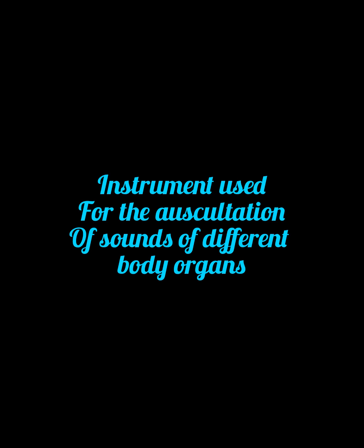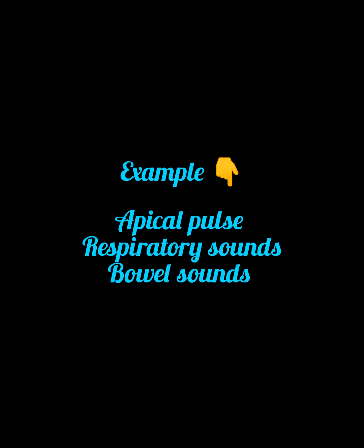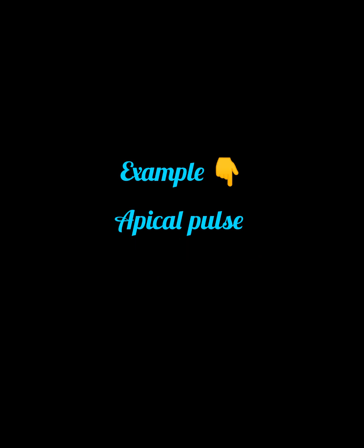So stethoscope is the instrument which is used for the auscultation of different sounds of the body. For example, apical pulse, respiratory sounds and bowel sounds.